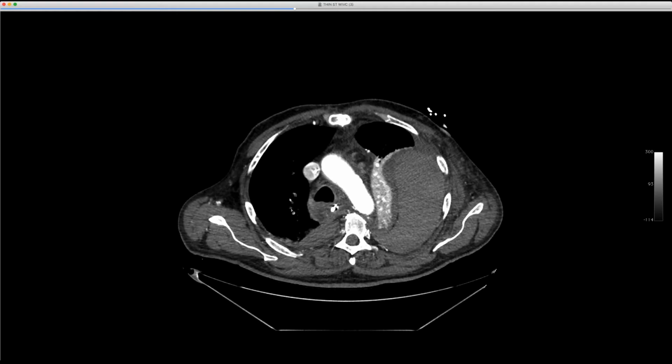So this is probably one of the bigger ones I've seen, but it was sort of like a parfait here. You got blood, fat, pleural fluid, collapsed lung. Perfect. All right. And then this last one is probably the most interesting case.